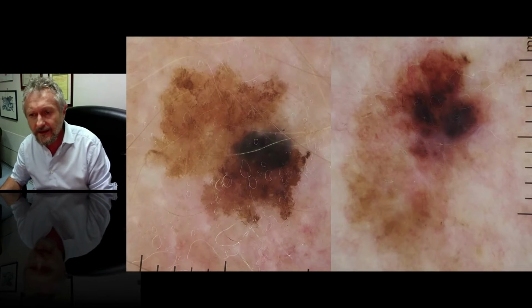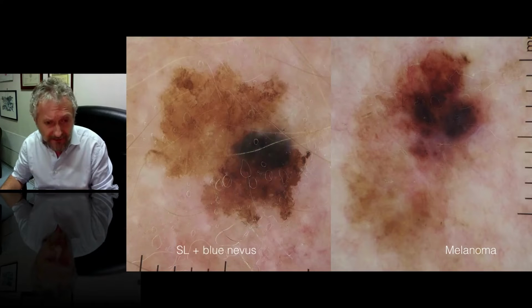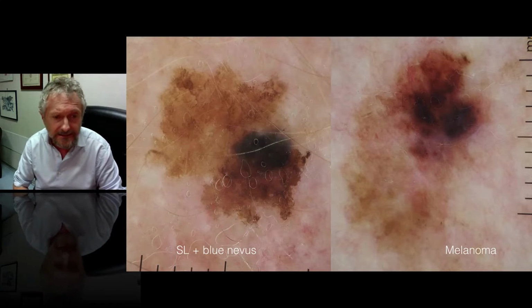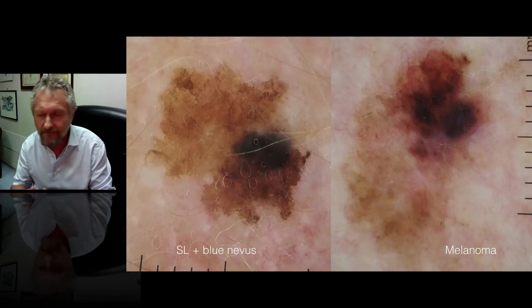So at the end of the day, the lesion on the right was melanoma, which was expected, and the lesion on the left, which was thought to be a very unusual, suspicious lesion, was a collision tumor, a solar lentigo plus a blue nevus. Could it be that there is, let's say, a common denominator between the solar lentigo and the blue nevus? No way.